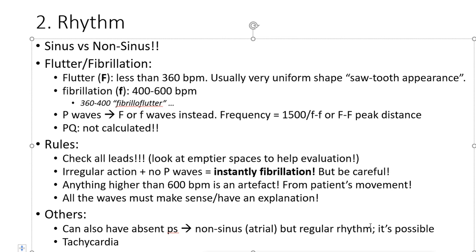And what is the detail behind it? It's called atrial rhythm, where the rhythm is not caused by the sinoatrial node, but by some other location within the atria. So we call it atrial rhythm, but it doesn't form these typical formations.